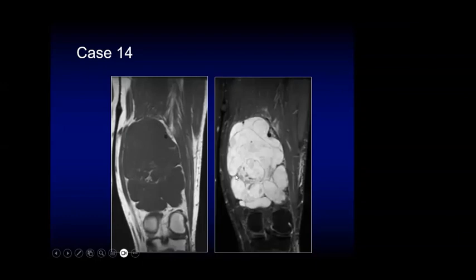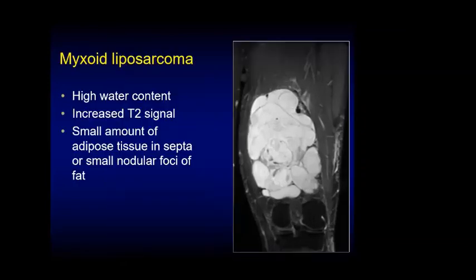So the tumor itself on the STIR sequence looks like what? Yeah, so like you said, it was myxomatous, yeah? Myxomatous tumor. With myxomatous tumor with fat in it, what do we call it? I don't know. Okay, so this is myxomatous liposarcoma.